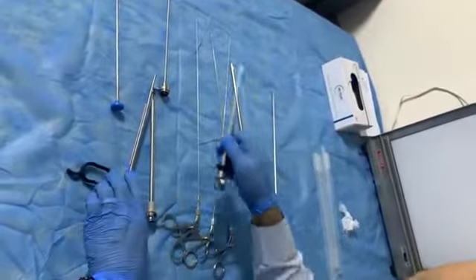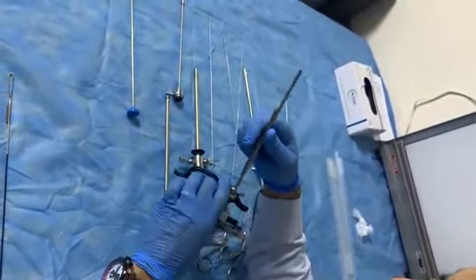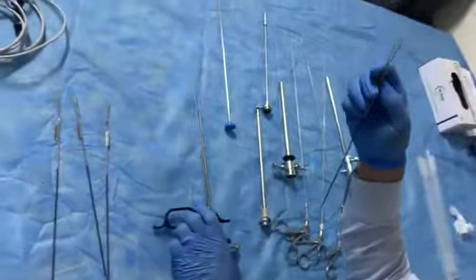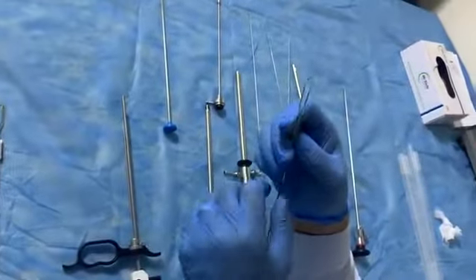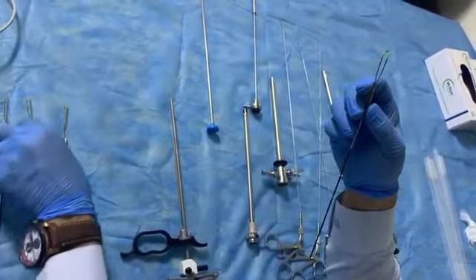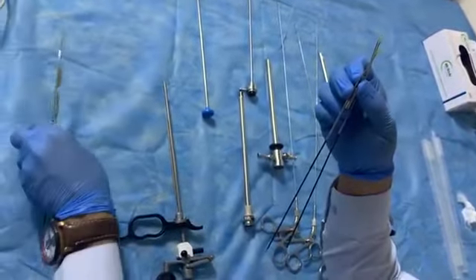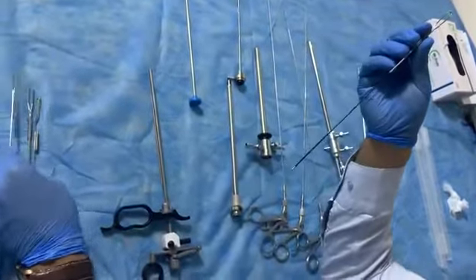Okay? So, when we want to do some procedure, we use this working machine and this electrode. Electrode has many types. This rolling. This is U-shape for doing some procedure inside the uterus, and another two types. Each one has its own function. Suppose I want to use this rolling.